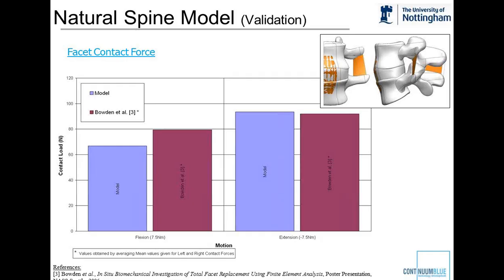So once we had built the model, we simply looked at the differences between displacements, stresses and fatigue responses of these types of models. And you can see straight away there is quite a dramatic change, as you'd expect, especially if you're missing a section of your bone. On the left-hand side, you've got your SBO model, which shows a lot more displacement in certain regions, while you've got your natural model on the right, which shows a little bit less motion and more rigidity.